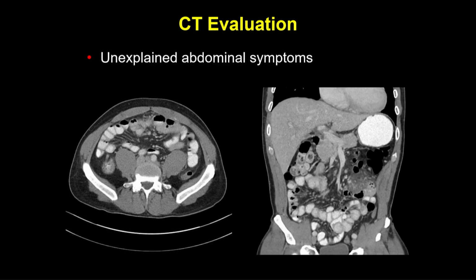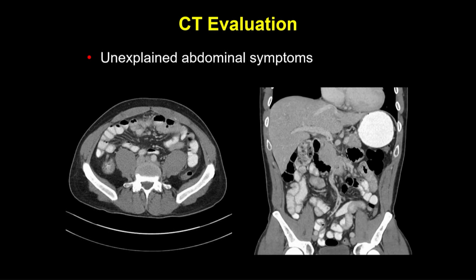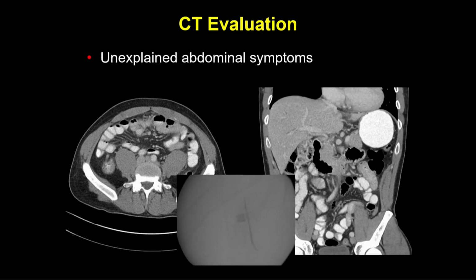So if you don't identify that foreign body, you might mistake this as a very aggressive tumor, or maybe some other aggressive inflammatory process. There's the specimen radiograph, and that's how I came upon this study. That radiograph came through, and I'm like, oh, that's cool. And then I went back, and it was an outside CT that showed the fishbone.